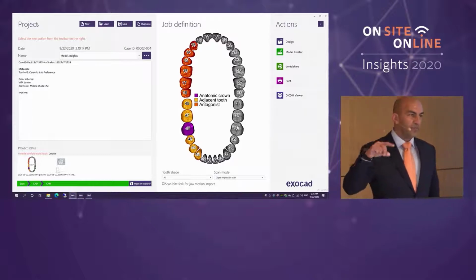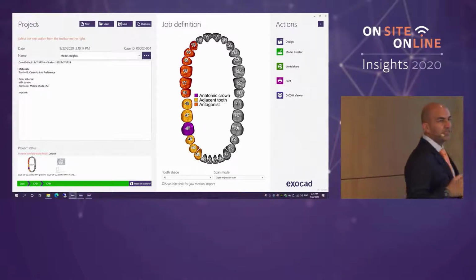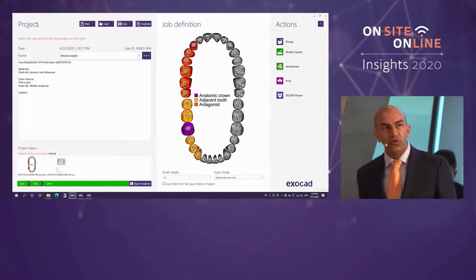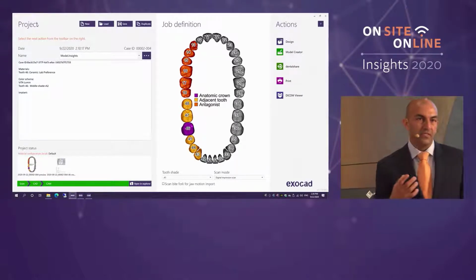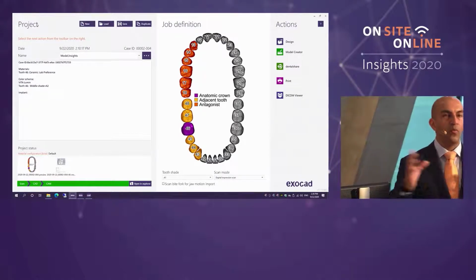I've done this on purpose. I've left the machine running on purpose because most of my clients that are doing this have their machines in their reception areas. It becomes a talking point for the practice, okay? It becomes a wow factor. And in my practice, 17 years doing chairside dentistry, everyone who's got one restoration has got more than one.